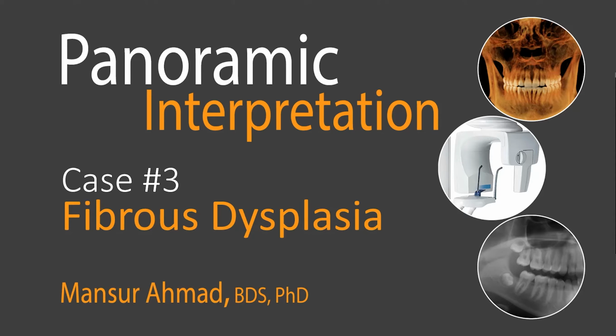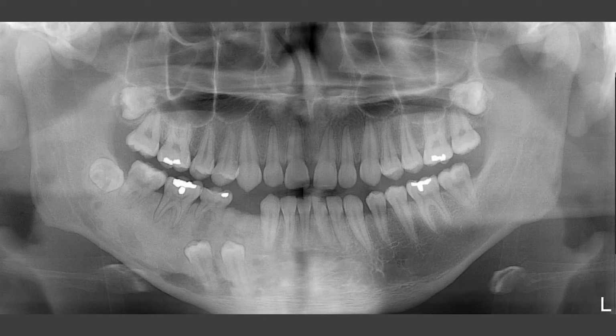Hello everyone. This is case 3 of the Panoramic Interpretation series for the summer seminar course at the University of Minnesota School of Dentistry. In this video, we are going to review a single panoramic radiograph of a young patient with fibrous dysplasia. Dr. Raj Gopalakrishnan had given this radiograph.